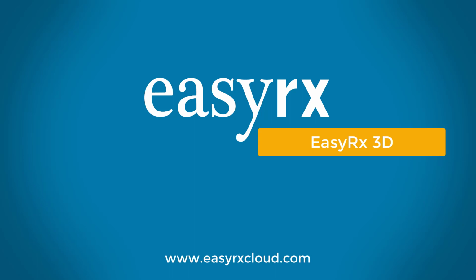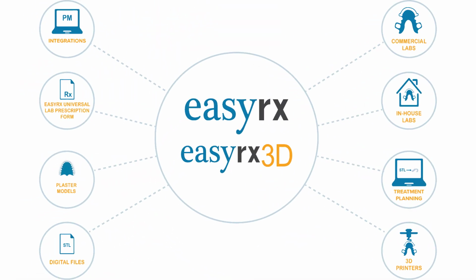We're excited to show you a closer look at EasyRx 3D. EasyRx is a universal lab prescription, digital workflow, and 3D software for practices and labs. Let us show you how EasyRx helps practices and labs better manage the entire lab prescription process. EasyRx integrates with practice management software products, making your workflow seamless.